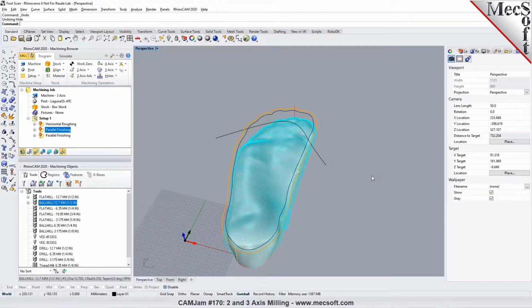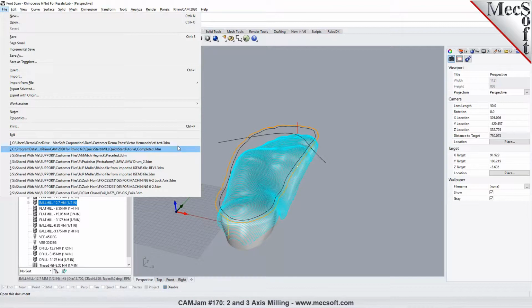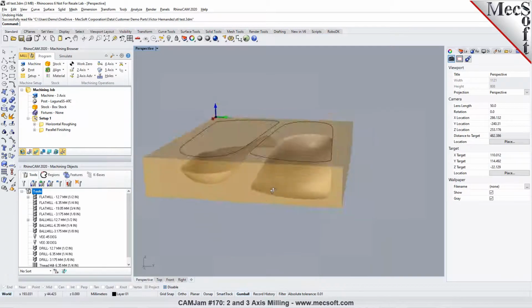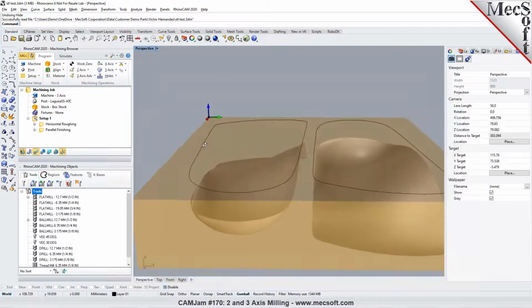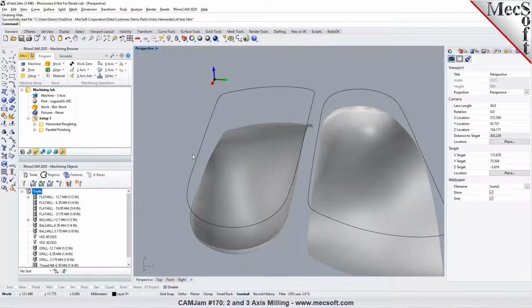Any other questions before we wrap up the demo for today? Just a quick one. As far as the file itself that we're using, let's say we want that scan to sit a certain way. We're always trying to put it into a neutral position, which means there should be three contact points: the center of the heel, the distal part of the big toe or the first metatarsal head, and the fifth metatarsal should always be the points where they touch first.